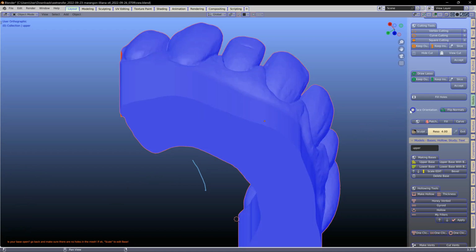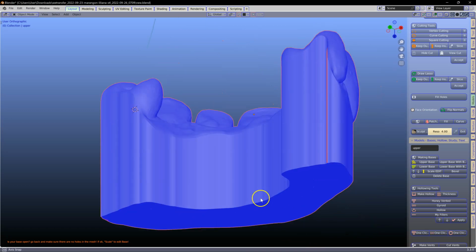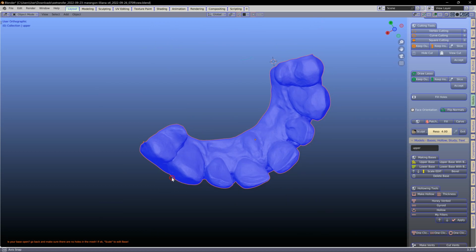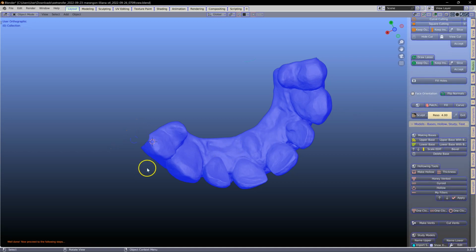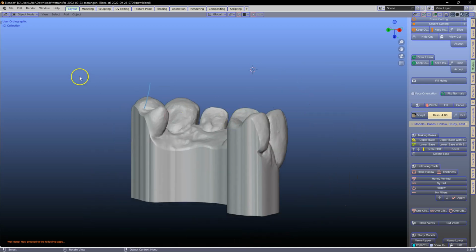What we see now in face orientation, that we've got a bit of a red mark there, which is not good. This tells me that the mesh is going to be a little bit defective. So what I'm going to do is put my cursor down, and we're going to take a lasso cutting tool, and I'm going to cut this corner off like that. Keep outside and accept that. And then we can continue. Now I've got a good model to work with.